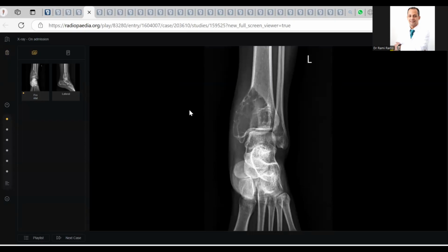Provided is the frontal radiograph of the ankle in a young patient. There is an expansile lytic lesion involving the metaepiphysis of the distal tibia, involving the medial malleolus. It is eccentric with coarsened trabeculation and cortical thinning. The tibiotalar joint is spared. It is extending till the joint surface, and no significant periosteal reaction. Soft tissue swelling is noted. No other focal bone lesions are noted.